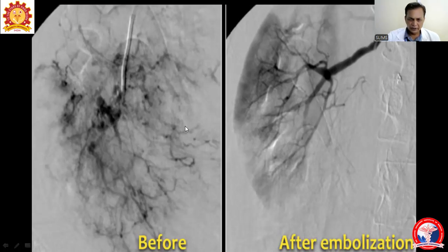This is the case of, again, angiomyolipoma, but the investigation, the study, is DSA. Here I have intentionally kept this slide because both slides are of the same patient. Here what we are seeing is the catheter angio of the renal artery through the DSA technique, digital subtraction angiography.